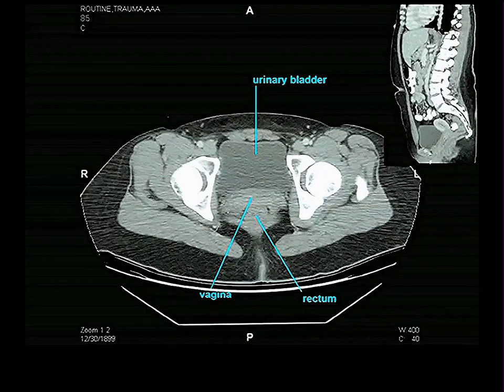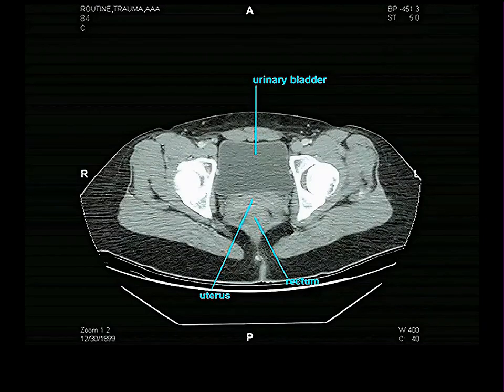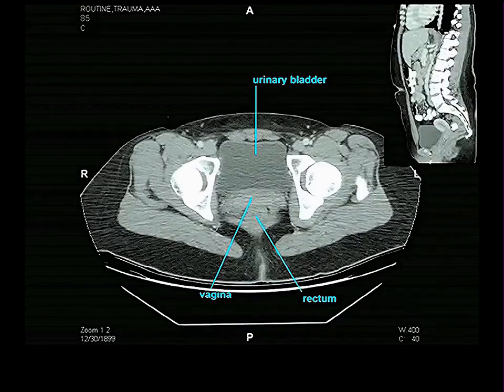No. Looks no different at all. I called it vagina because, in my imagination, I thought this is where the external os of the cervix was. I thought this was cervix in this person, and everything below that must be vagina, and that coincided with the tip of the coccyx. So in these CT scans, when I got to the tip of the coccyx, I changed the name to vagina. But there's no possible way that you can tell just from looking at a CT scan when cervix passes to vagina.